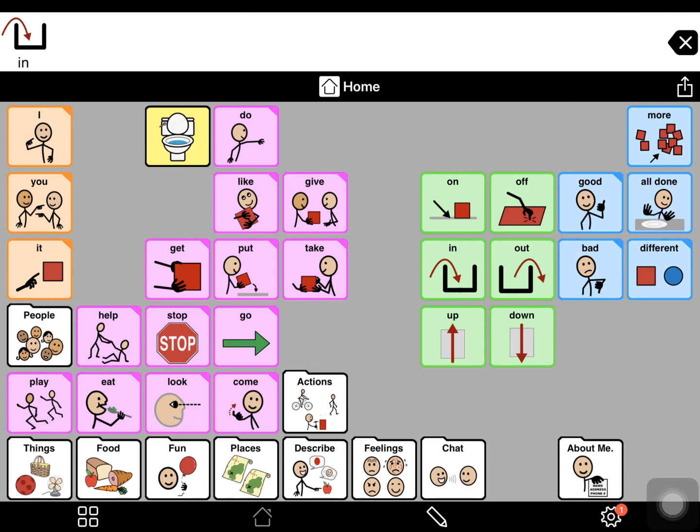So one of the things we've noticed with TeleAAC, if we are using QuickTime to connect our device to the computer with a cord, or if we are even using Zoom or any other platform where you can AirPlay your screen, what we're noticing is that students or parents or communication partners are having a hard time discerning where we're pointing, right? Because we're clicking, it doesn't give as much feedback other than the button moves slightly.